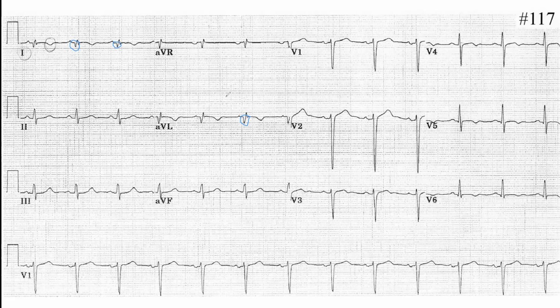Next, in these same leads, you should look at the ST segment, whether it's elevated or not, to see whether in time it's acute. If you have Q waves and ST elevation it's acute, but there is no ST elevation because it should be more than 1 millimeter in the limb leads.